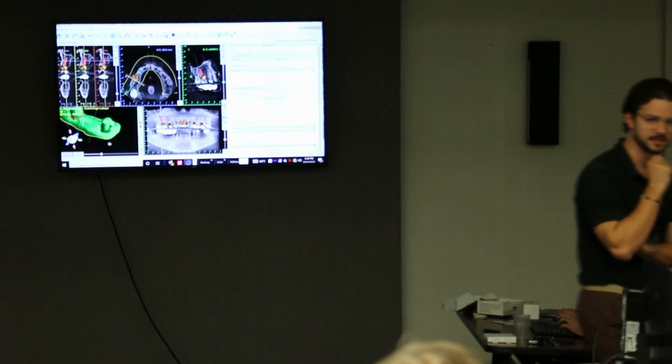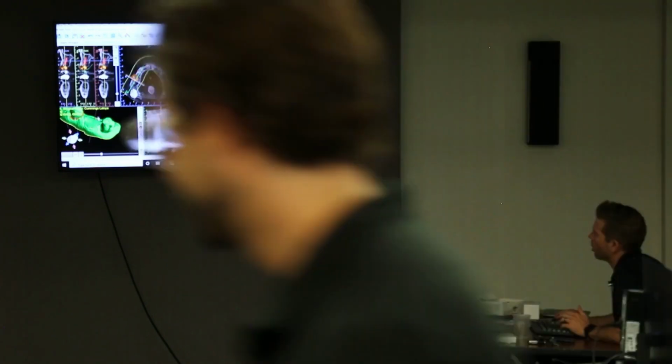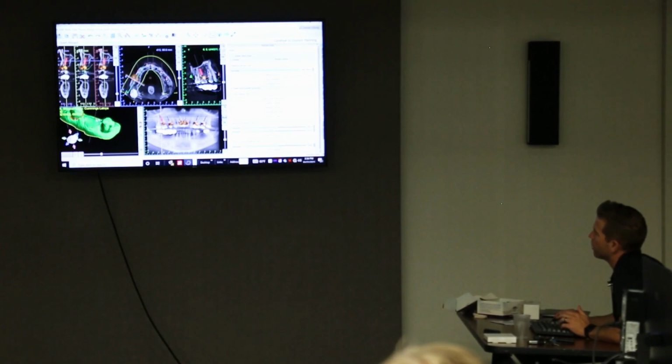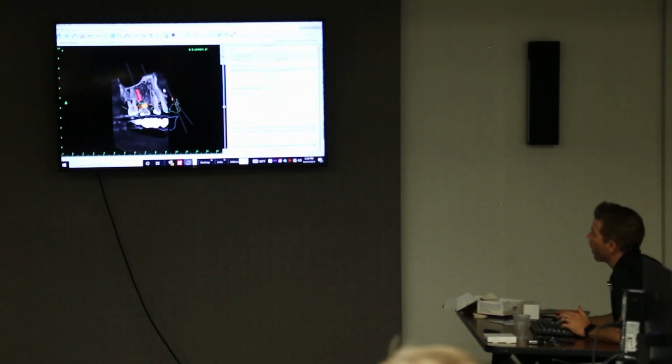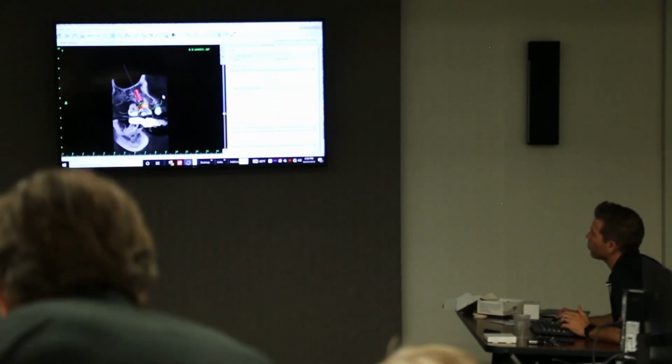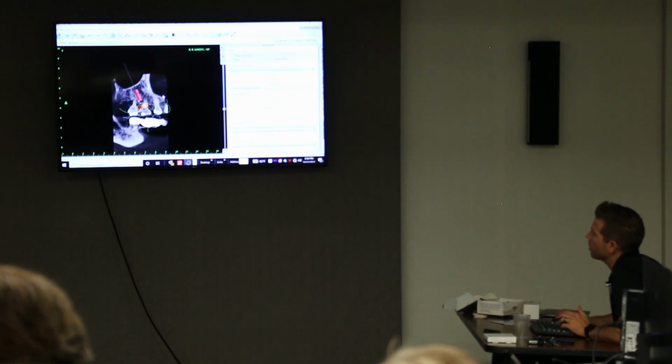Okay, guys, so this is important. Just grab me if you need. What I like to do is select the implant that you're wanting to get this model edited. So this is the posterior right implant number 3. Now, this is the key view up here, and when I roll my mouse here, it's rolling around the implant. That's really important because I'm getting a spin around this implant here.